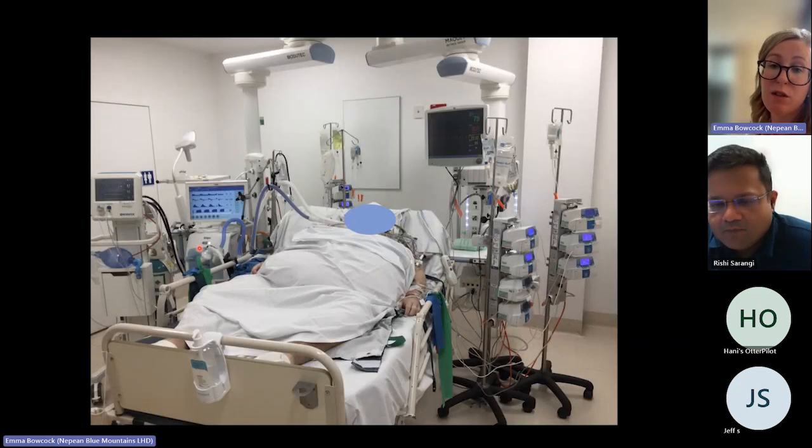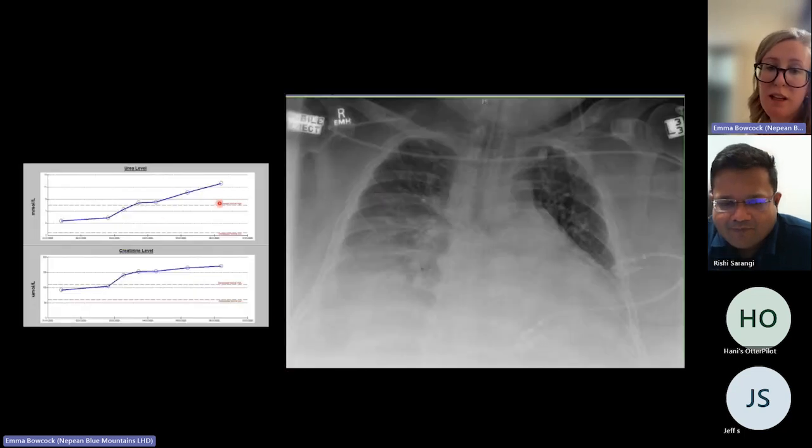And then there's times, of course, where we need more than a transthoracic echo. Obese patient, you can't see a thing. He's got all the, you know, nitric on, ARDS, pretty bad. It actually was more atelectatic than ARDS. I think he's got some levosimendan running in the background there. Kidneys going off. This is what the X-ray looked like.